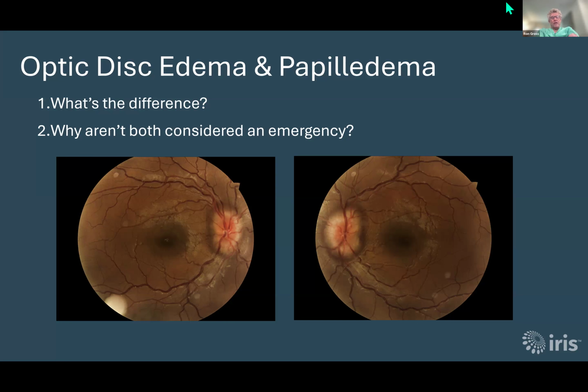You should be familiar with it, where our grader lets us know and we let you know with specific people so that this can be addressed immediately. It is possible that this is only in one eye. Sometimes you get optic nerve swelling for other reasons, and in most cases, that is not an emergency. That's something that's only affecting one eye.